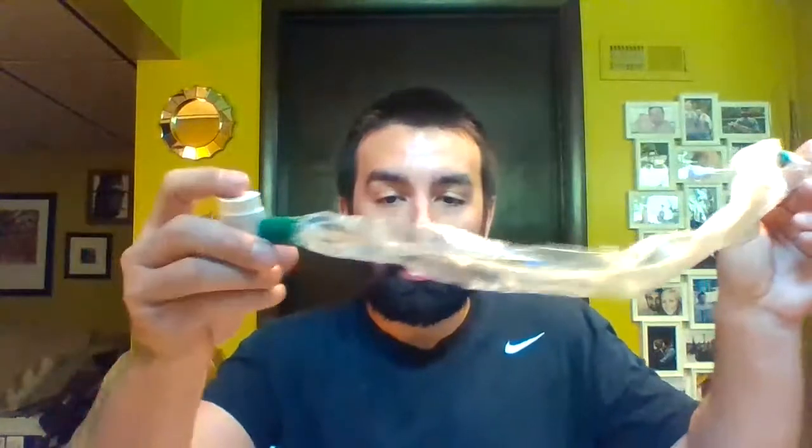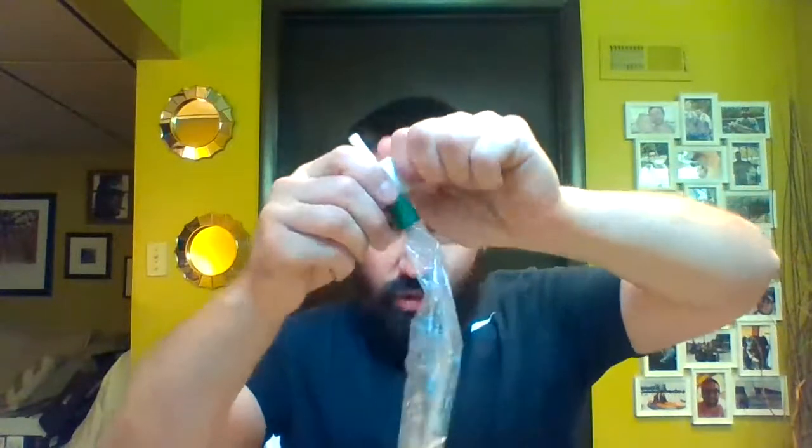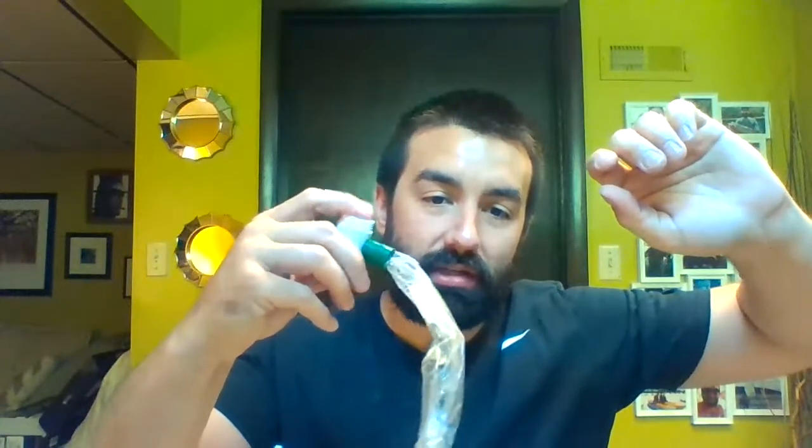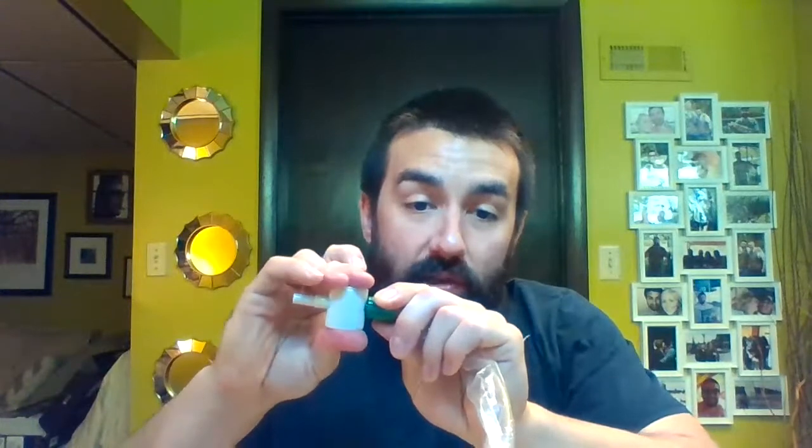You're using a regular suction catheter. You're still going to have a different thumb control port. With this one, I showed you this thing locks, so if you twist it before you go down, make sure it's not locked. Okay, likewise, I try and lock it before I leave. That way the patient doesn't end up getting suction when they're not wanting it. But that doesn't apply vacuum until you press and hold on that. Your suction tubing hooks up down here.